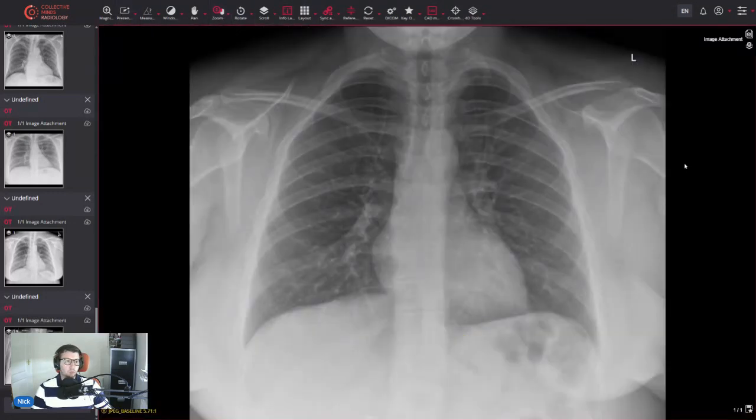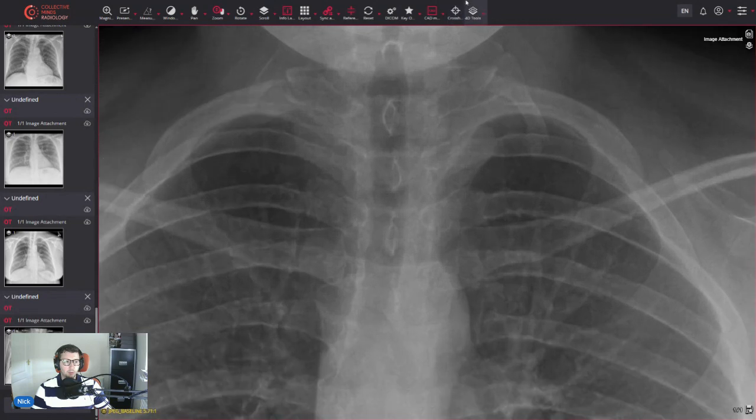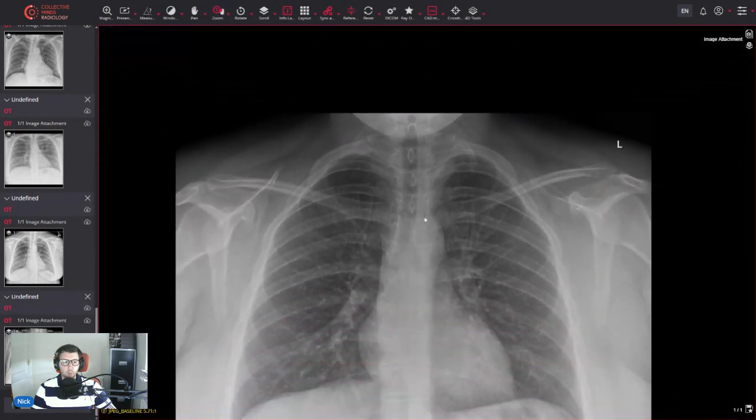This one on the face of it looks absolutely fine. So you've done all your checks of the lungs and mediastinum, and you're just about to verify your report when you notice something going on up here. So this patient's got bony cervical ribs, smaller on this right side.